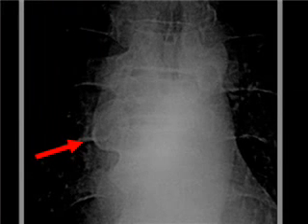And if you look carefully on the frontal view of this patient, you can see that the red arrow is pointing to a very large osteophyte at this level, which can be easily mistaken for a lung nodule.